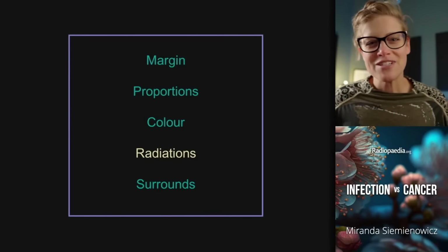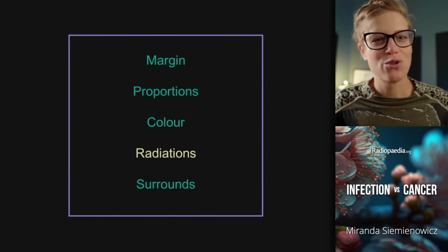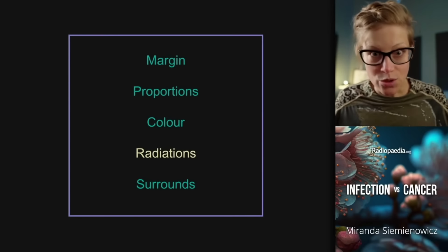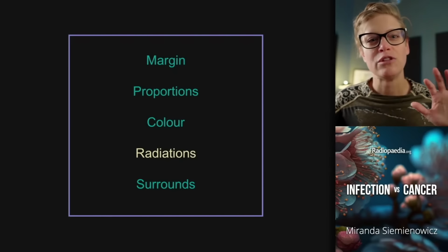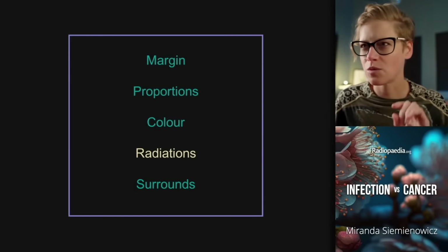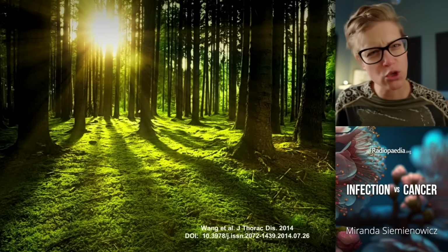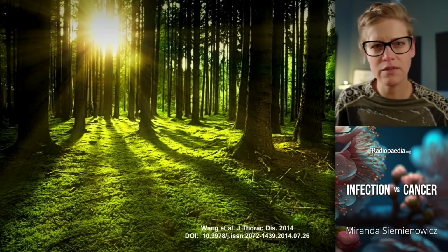Radiations emanating from lesions are one of my favorite things, and I think everybody else loves them too, because everybody wants to call a lesion spiculated, whether it's cancer or not. I want to reserve this term spiculation for lesions that I'm flagging for malignancy. So what we're comfortable with looking for is this corona radiata, the malignant spiculations, the malignant radiations.